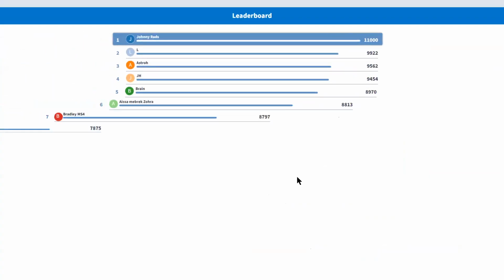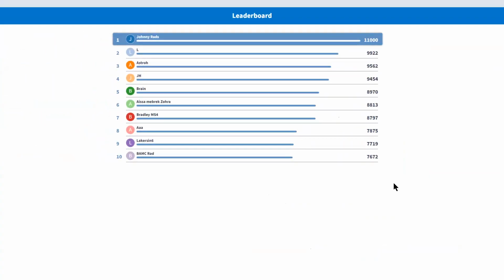Okay, great. So the correct answer here is pilocytic astrocytoma on identifying cerebellar mass with contrast enhancement that has very high ADC values.